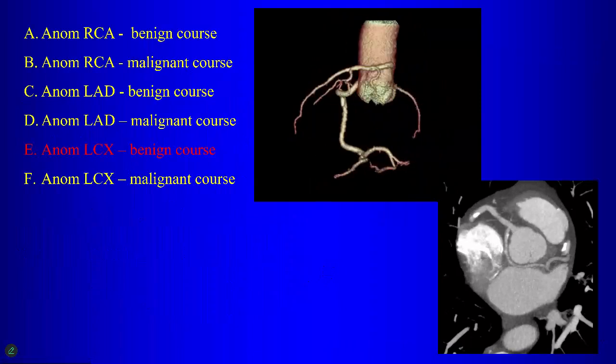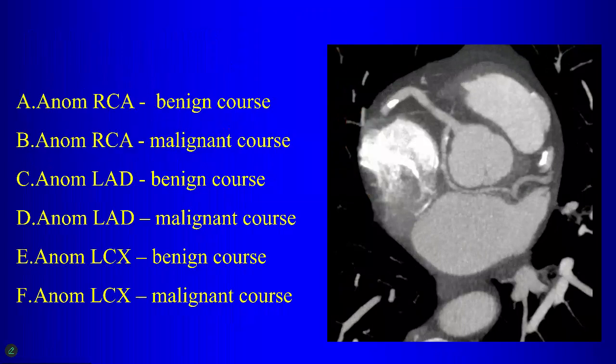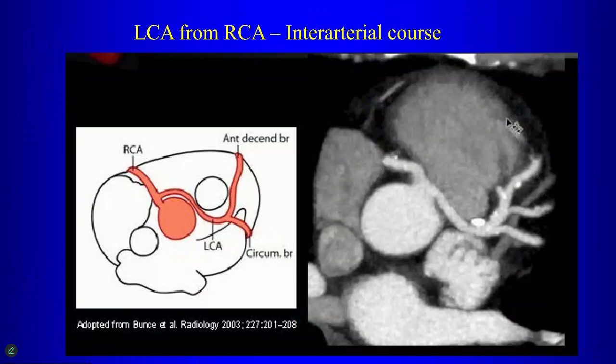Dr. Malgin, on the previous contrasted CT, was there a way to see prior, even before this one? Lots of slides back, sorry I didn't ask earlier. On this one, would you be able to tell which cusp that's coming off of? Well, it looks like it shares a common origin with the right, so I'd say it's coming off the right cusp there.